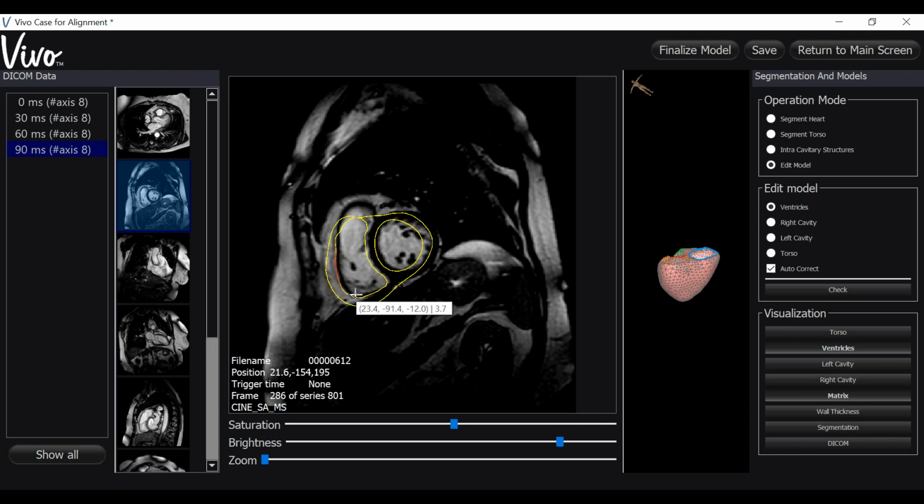If the yellow line snaps back to the original position, try decreasing the amount of red area by using Control and scroll wheel back. Sometimes it wants you to make very small adjustments to the outline. So if you see a blue spinning wheel or if you get a snap back, just make your red area smaller and try doing it that way.